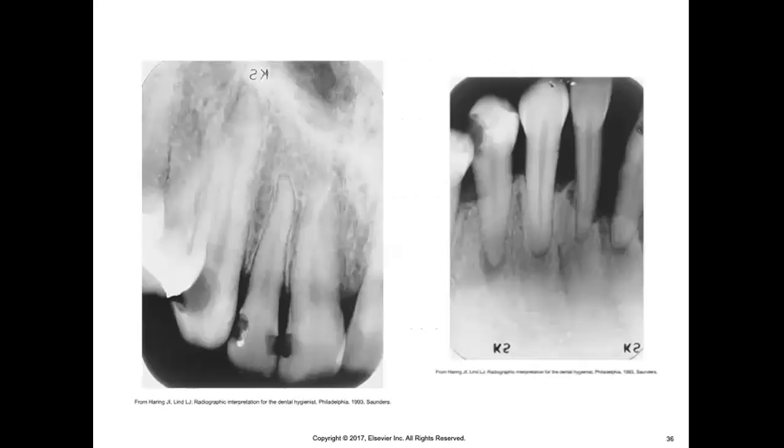So here we have some radiographic images here. This results from a pulpal death or necrosis or inflammation of the pulp. These are typically asymptomatic, but sometimes have a history of prolonged sensitivity to heat or cold. Here we can see tooth number 7. If you look right around the periodontal ligament space, it is actually widened. This is this radiolucent line around the tooth. If we look at the rest of the teeth, we don't see that, but on tooth number 7, it is widened.